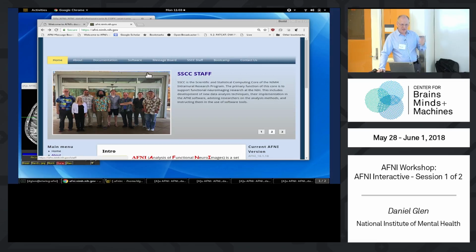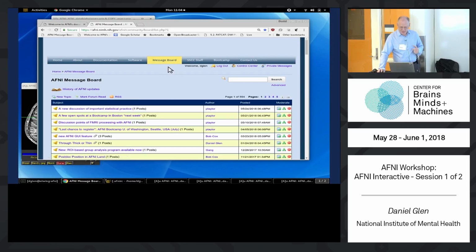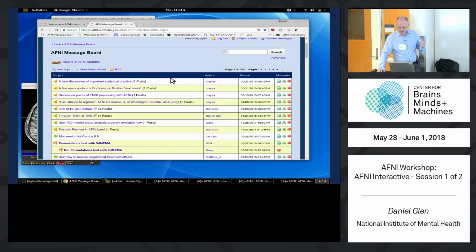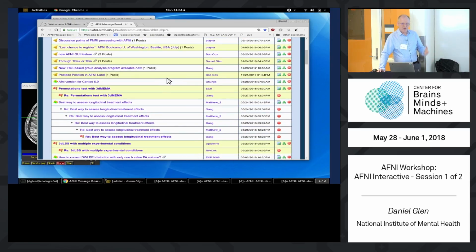There's our class handouts. We have some videos from the class, but probably the most used one is our message board. So click on the message board tab, and you have to register, as Rick said. And here we have more than 20 years of messages, questions, and answers.